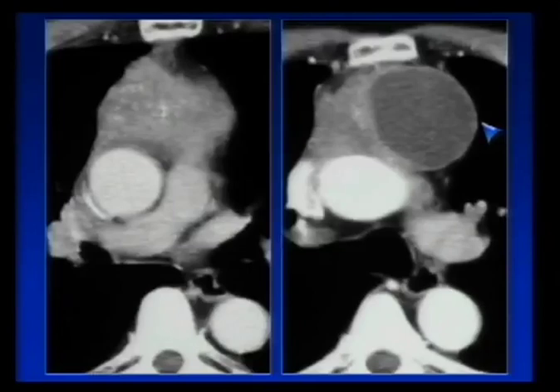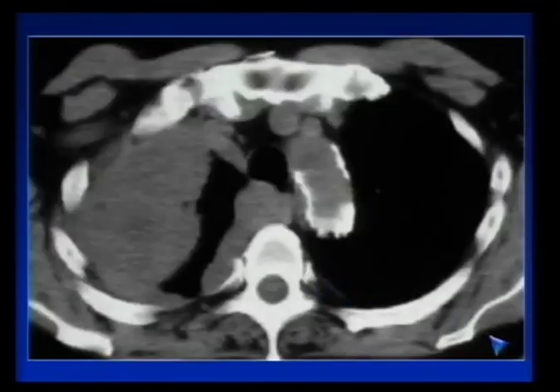Now, it's not a thymic cyst, in that a thymic cyst is typically mainly just a big cyst. This is a thymoma that has cystic elements and calcification. It's irregularly marginated and also ill-defined. It may well have been an invasive thymoma, but we didn't see it invading anywhere, so we just call this a thymoma.